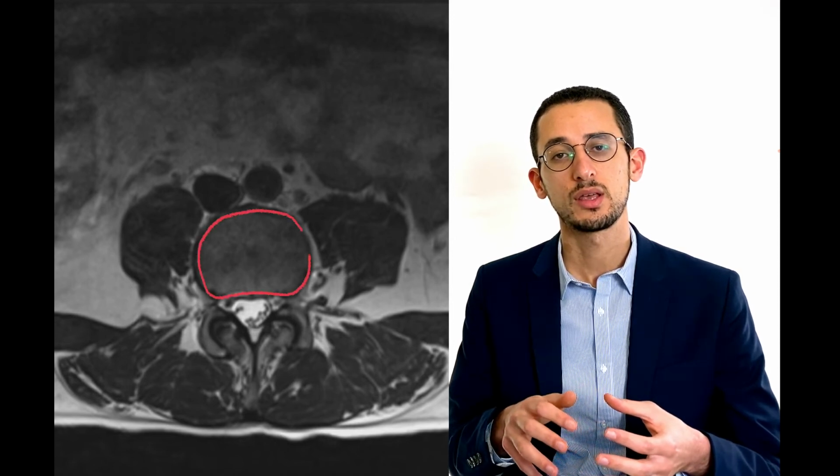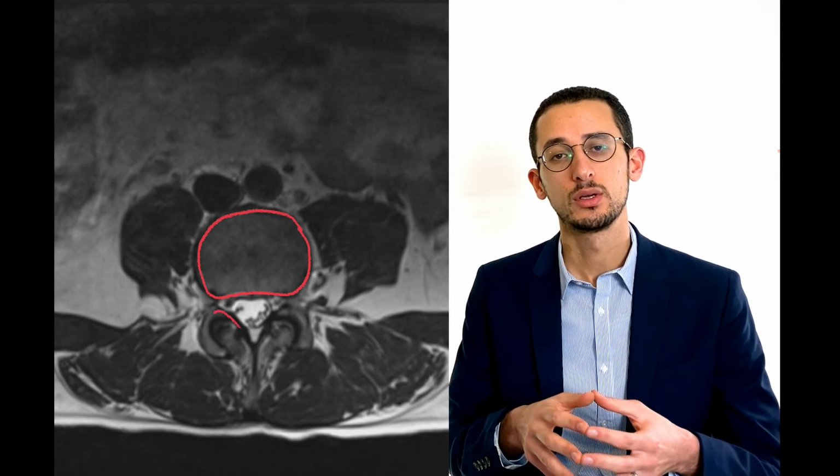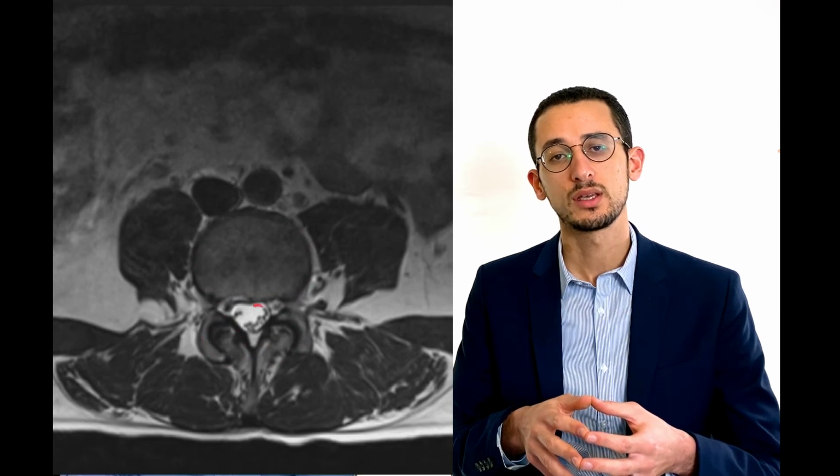This is another view, which is an axial section through the normal spine, where you can see the circular thing is the vertebral body, and these areas are called facets. And if you can see in the middle, the white thing again is the cerebrospinal fluid, and you can see little black dots inside, which are the nerves going through this fluid. So Mohammed's given a lovely description of what a normal sagittal and axial MRI of the lumbar spine looks like.